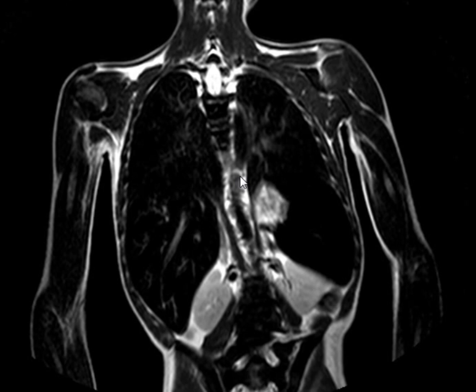So when you have a case of thalassemia with splenomegaly and generalized bone marrow signal loss, what do you look for on the lumbar or dorsolumbar spine? Now you look for extramedullary hematopoiesis, which manifests as soft tissue masses around the vertebral bodies.